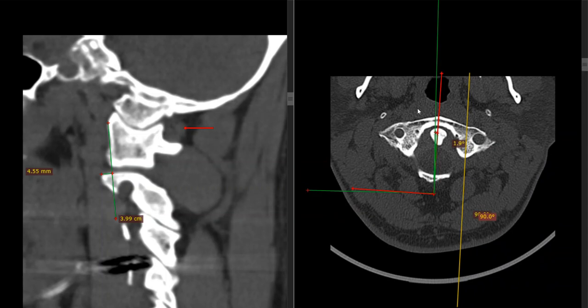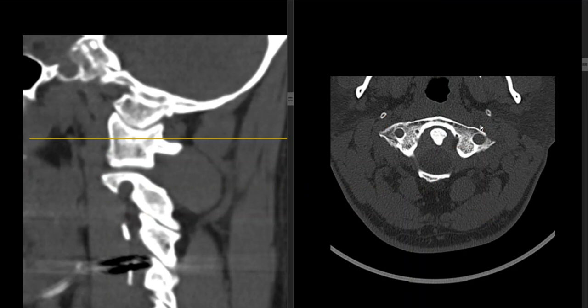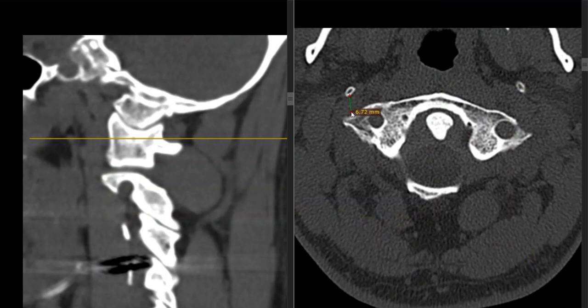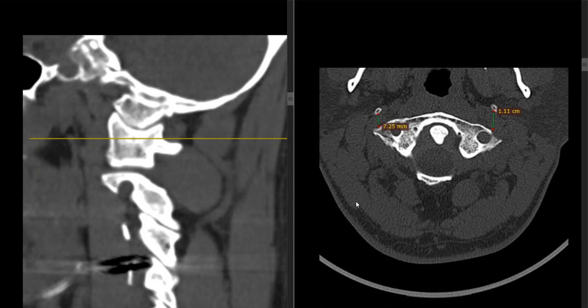Now the styloids, you can see a difference between this, just to reference. The difference is that this side has where the jugular vein comes through, and if the jugular vein crosses this path in between, which it normally does, there's lesser space here than there is here. Normally you want more than 7 millimeters between this, so you're just at that range. And then this guy, you can see how far away he is. So he's roughly about 1 cm. Does that cause a problem? It all depends on what an angiogram would look like, and that's what you would want to get.